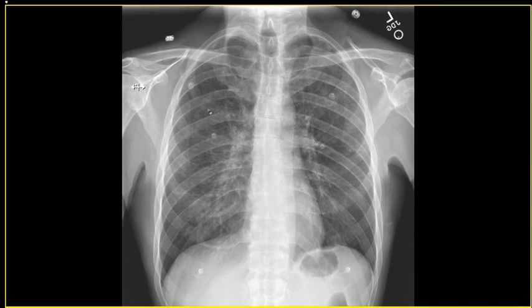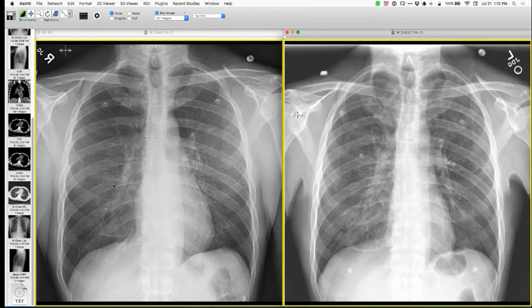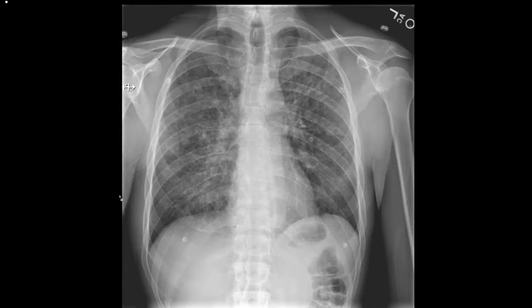They are multifocal, hard to describe, maybe just focal, subsegmental size. Some people might use the word ground glass opacity to describe that, but sometimes it's easier to perceive that something is wrong or present rather than easy to describe it. So that is on the 12th, and I will show you early July. Certainly here you can see now he has a diffuse process. So it was present before, but very abnormal at this point in time.